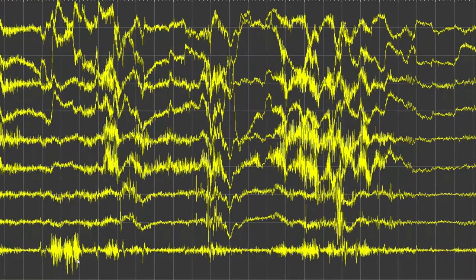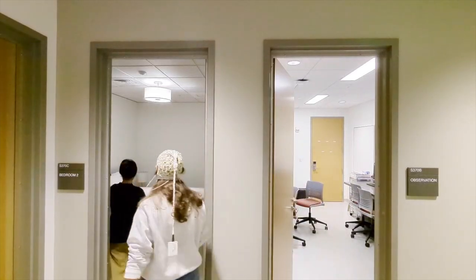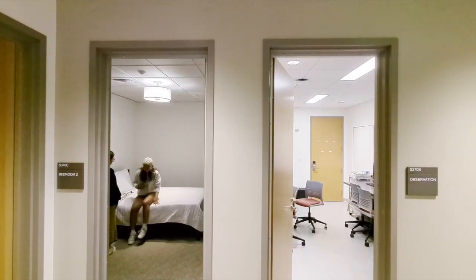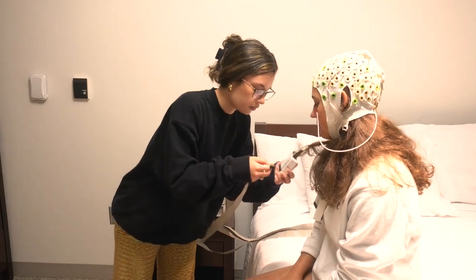You can learn more details about how EEG is collected in general in the video about EEG and event-related potentials in the same textbook resource. Here, we will focus on how we use EEG to study sleep. When we study sleep, we pay attention to large fluctuations of potential over time, which look like waves in the EEG recording. We often call them waveforms or brain waves.